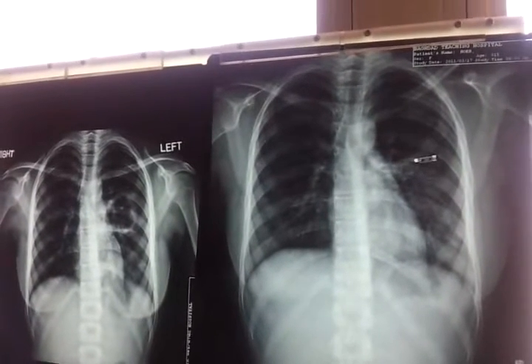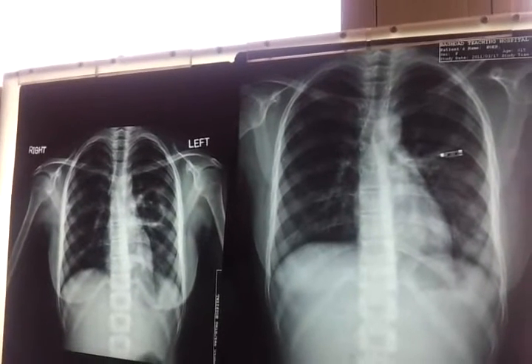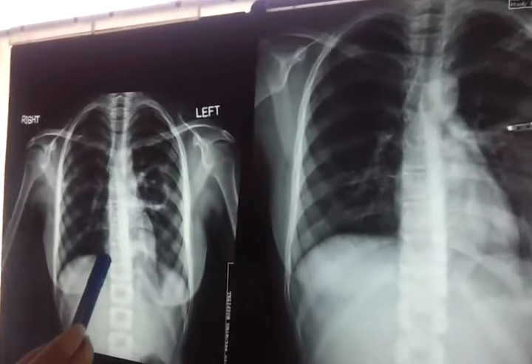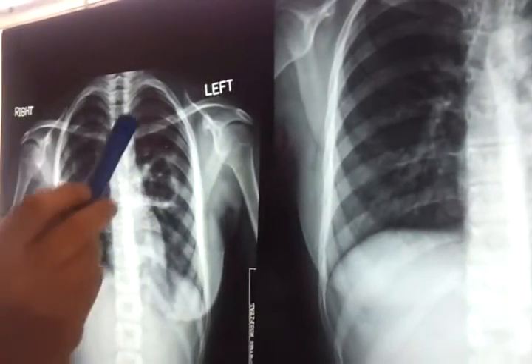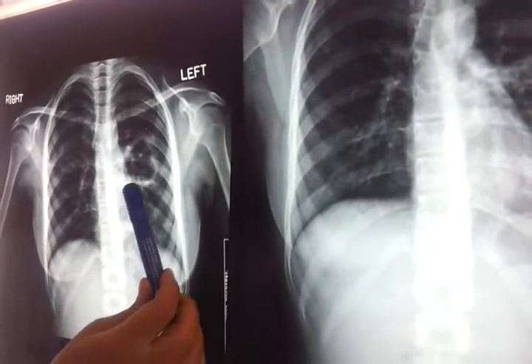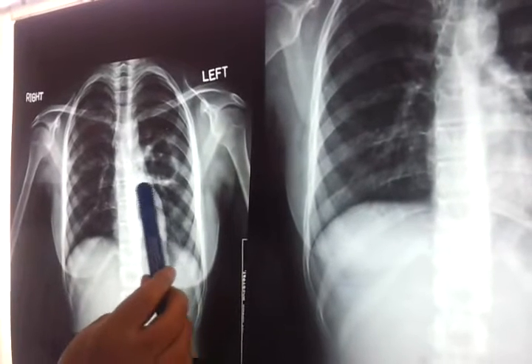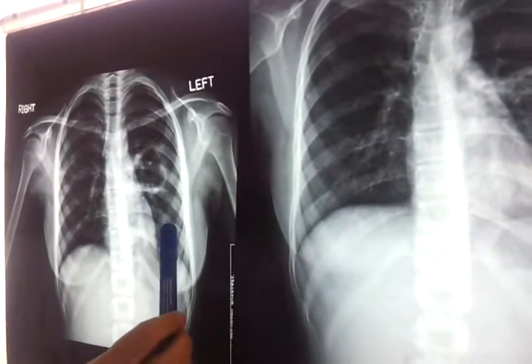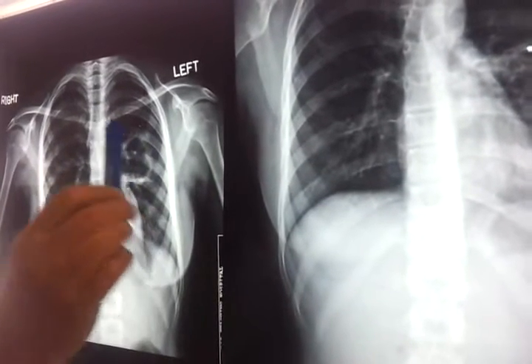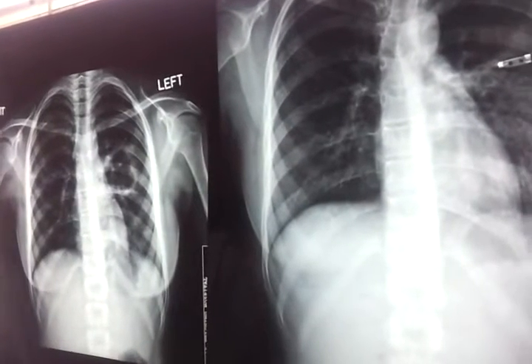It is considered strange, a younger age group in the middle lobe. This is not the middle lobe. The middle lobe on the right, here is the middle lobe. Lingula. This is in the lower part of the upper lobe, and even not in the lingula, because the lingula is just attaching to the heart here in this area. This is the lower lobe, this is the lingula, and this is the upper lobe. This is a lower part of the upper lobe tuberculosis, left upper lobe.